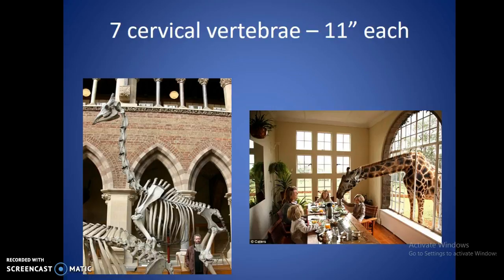Not all that different. If you look at some of the other bones, there obviously are going to be different. There are no tails on people, obviously. You can see the ribs, though. The thoracic spine has some spinous processes on the back there. There's a little bit more upright going across on that.